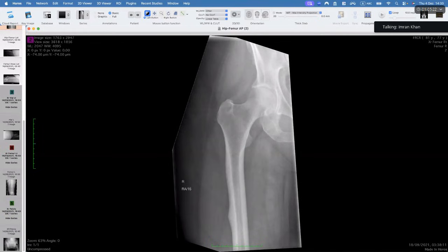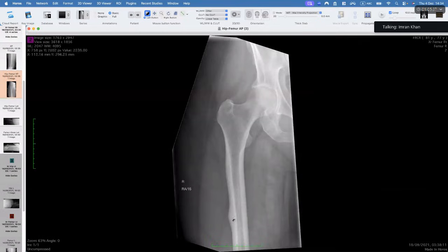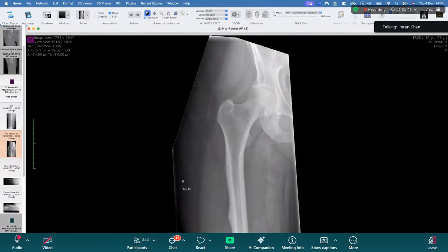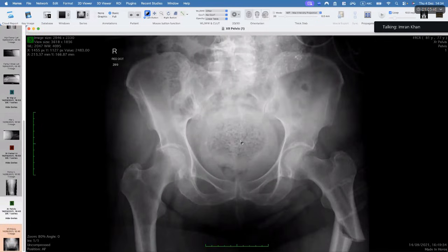They get these fractures in the proximal femur, within 4 or 5 centimeters of the intertrochanteric line, okay? The insufficiency fractures usually start at the lateral margin, which we saw on the other side, okay? So they'll start there. And there's literally no specific history of trauma when these patients come in. It's a minor trauma and then the bone goes, okay? So this is a very classic appearance, right?